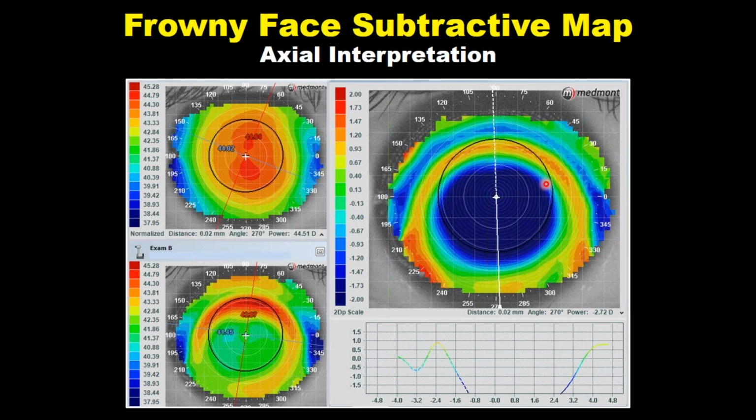Now we might ask, is this as good as it gets? Is this what the patient should expect to have based on corneal displacement? So we might wander over to the baseline topography, and do we see contours that would indicate that the lens should ride low? In this case, we have a pretty symmetric cap of the cornea.